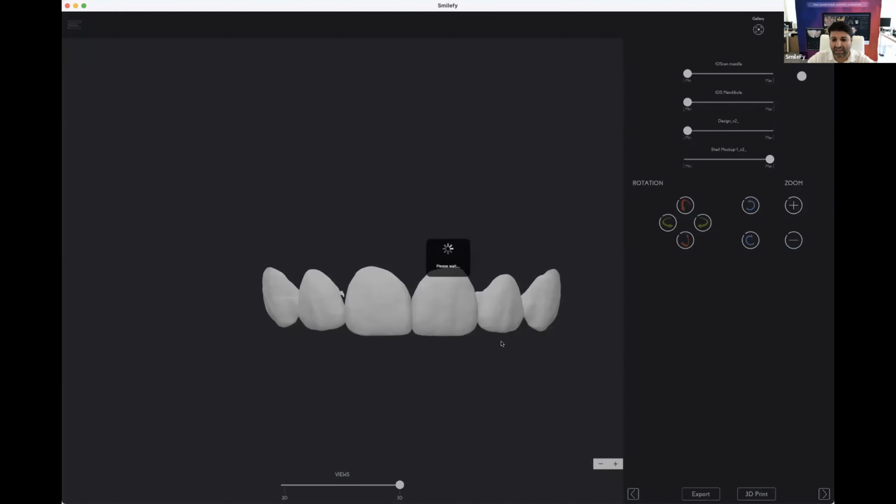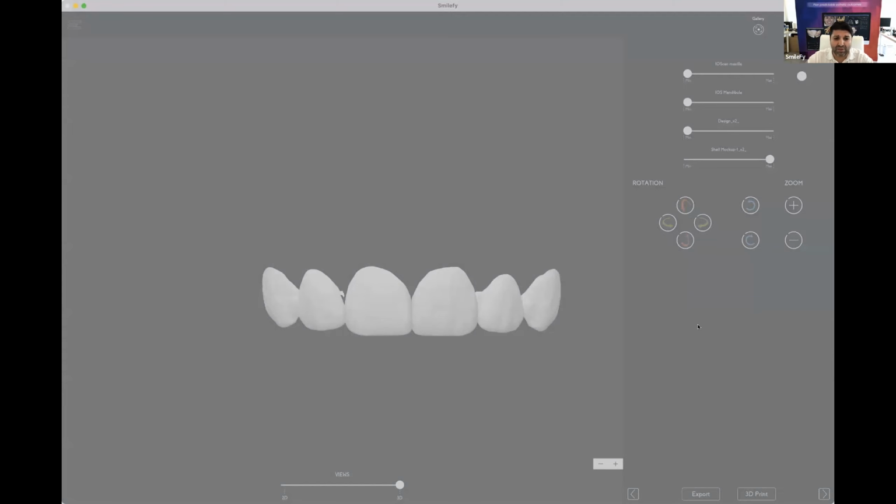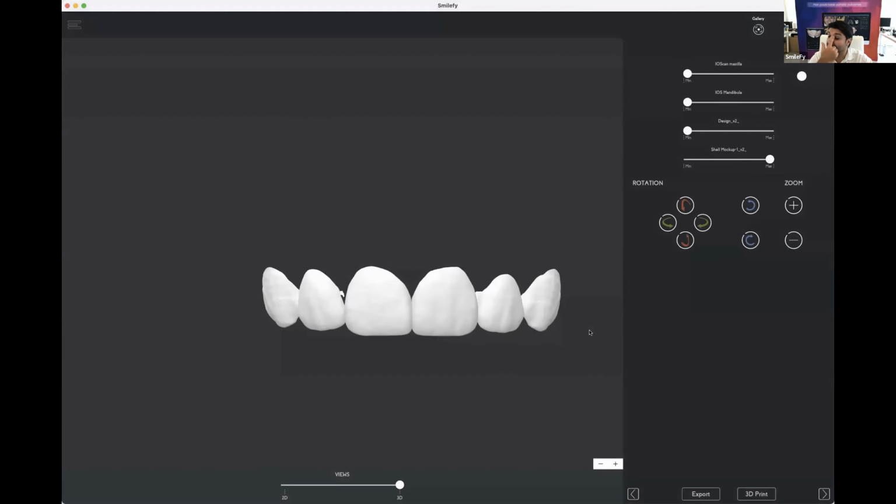Oh, let me export and show you. Plus, then you can send to the 3D print. Can the software design gingival reduction guides? Yes, that's gonna be, we are not done yet. I suppose we're gonna need around 4 weeks, and you are gonna be able to export and to produce the crown lengthening guides, and then you're gonna be able to export, to print, and to use them.